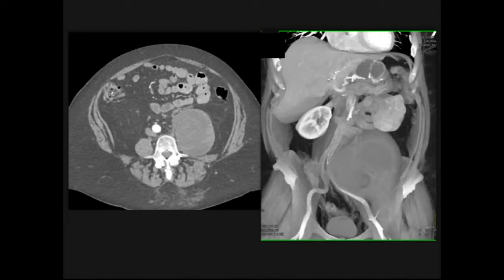You say it's not fatty, but a lot of the retroperitoneal liposarcomas, and this in fact was a retroperitoneal liposarcoma, really don't show much, if any, fat. A psoas bleed, the psoas looks enlarged, it tracks the length of the psoas. I guess it's a possibility. What this isn't is a neurofibroma.